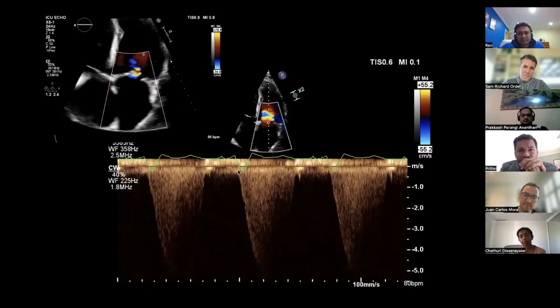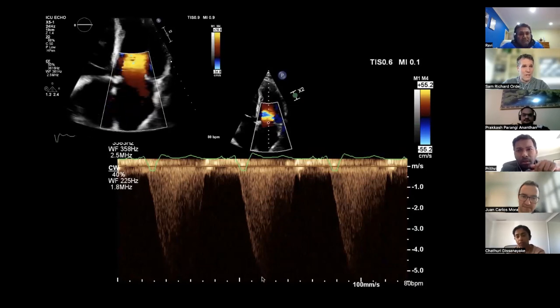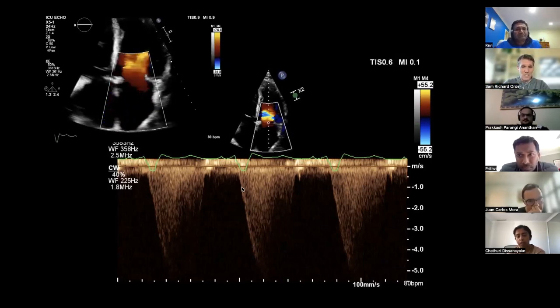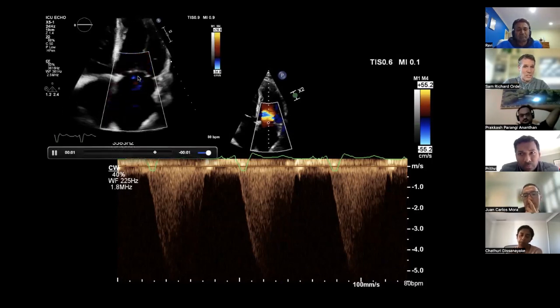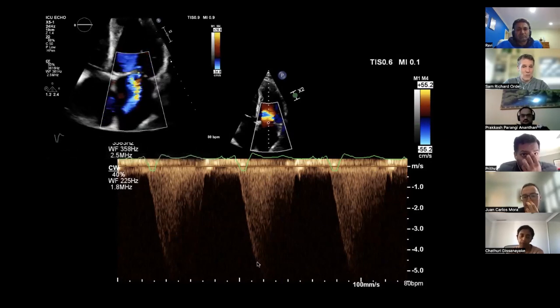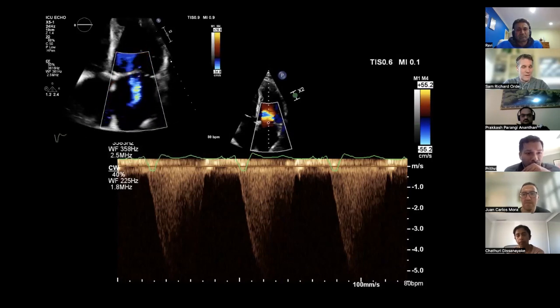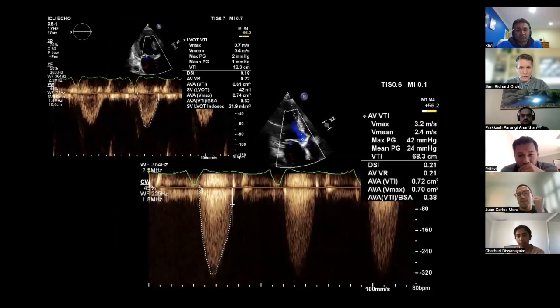This one. What else can you see on this trace? So we've got a really slow rise of that mitral regurg. Yeah. And so potentially, what else could you show from that? If I just gave you that Doppler trace, you should be able to say, well, that's a dP/dt waiting to be asked for. We've got a central regurgitation jet, which is why I showed you this one. We've got a cursor that's in nice orientation. With a central jet in sinus rhythm, we can do the dP/dt, which will be clearly reduced, in less than 800, again indicating we've got a terrible left ventricle function.